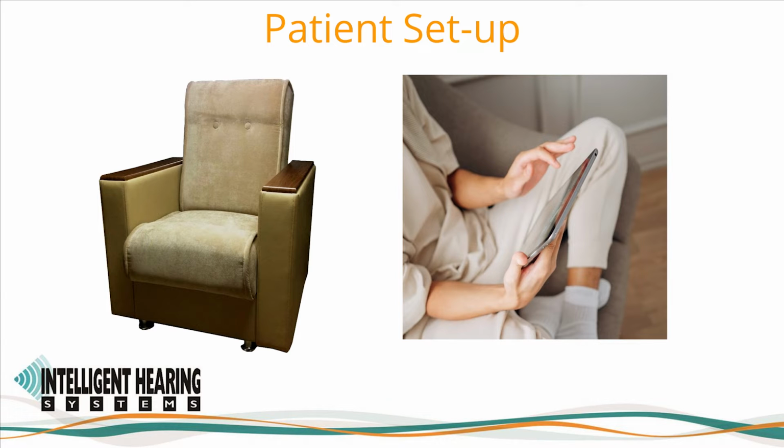There should be no talking during the test, and the patient should focus solely on the movie being played or the task being instructed. P300 testing, for example, will require the patient to be alert, attentive, and count the oddball, uncommon, rare stimuli. If the tablets are used and will be held by the patient, then they should not touch any electrode leads during testing.